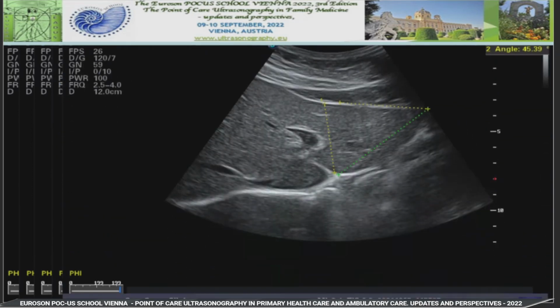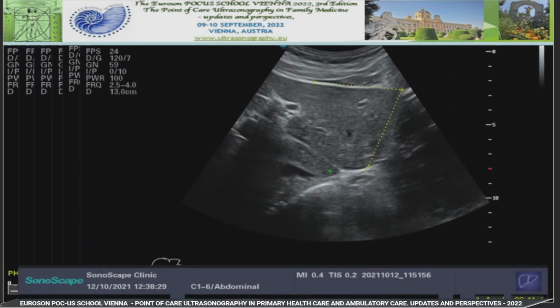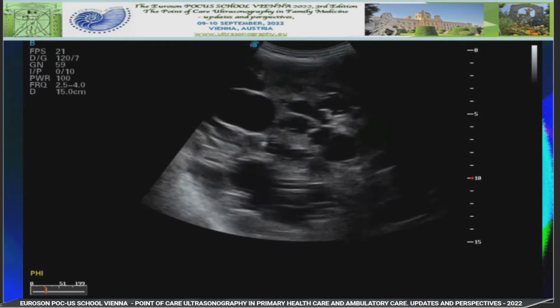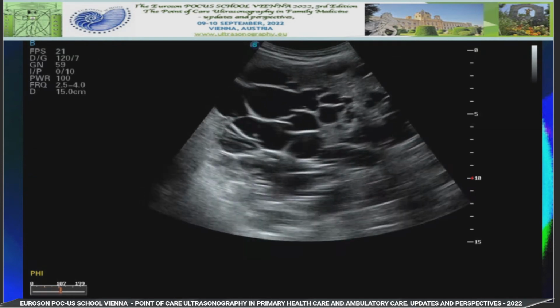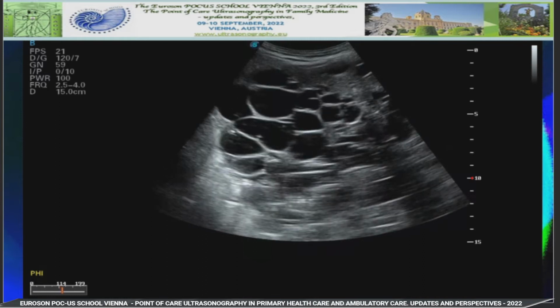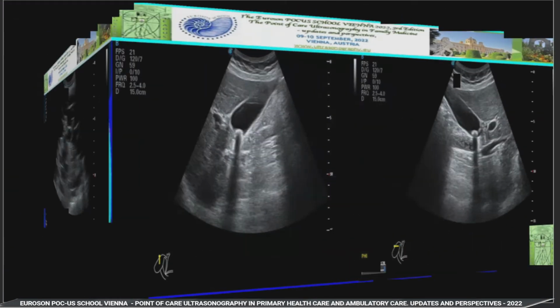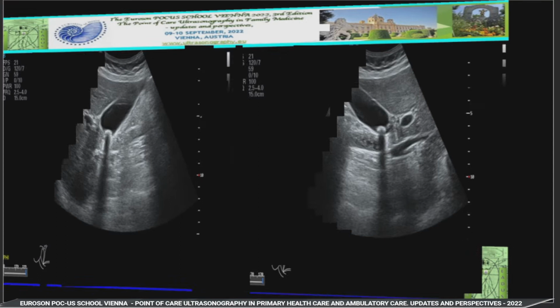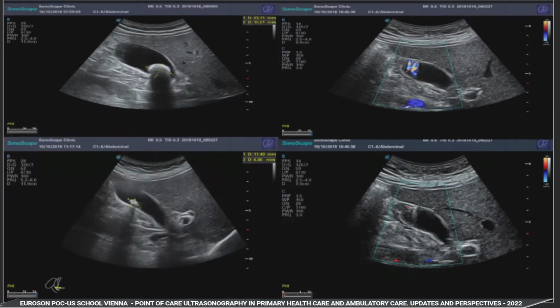the bidimensional grayscale ultrasound to start, and you can find some aspects of the enlarged left liver lobe, or like in this liver with aspects of honeycomb, and this is the multicystic liver. And you put the diagnosis in your praxis. These are gallbladder stones in the subcostal section, and also in the longitudinal mediosternal image.